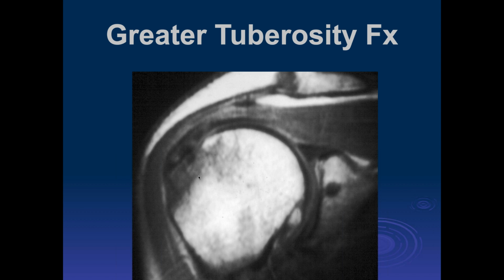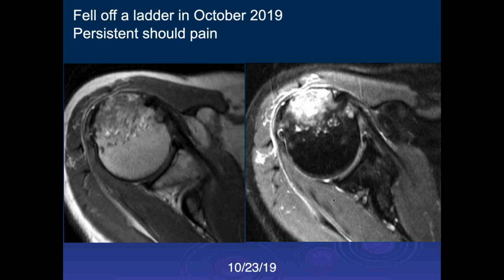Is that a loose body down there in the joint inferiorly? Right here, you mean? Yeah. I don't remember, John. I'd have to look at all the other images. And the dark structure that you're looking at, is that a surgical... This is a bone island. Bone island? Yeah, but we'd need the other images to confirm that. Well, okay, I'm sorry, that's fine. I'm jumping the gun. Well, that's okay.